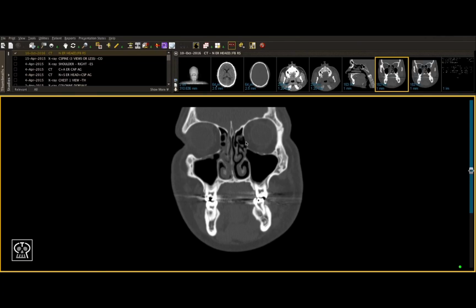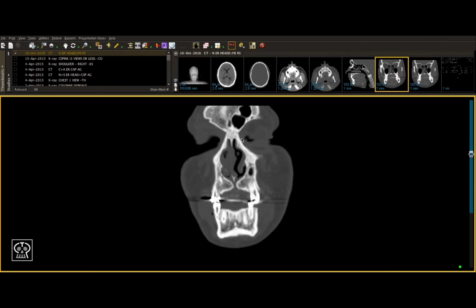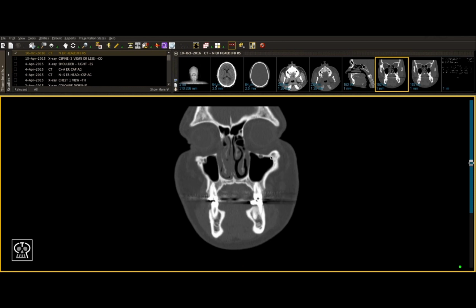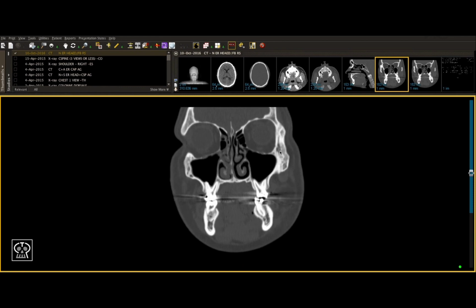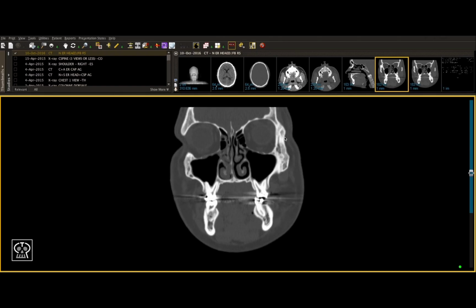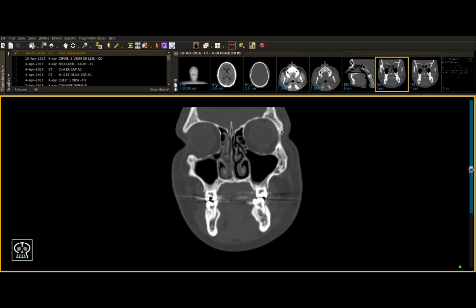later in this video. Once again, starting anteriorly, you always want to examine one side at a time, looking for any obvious fractures of the orbital rims. It's important once again not to be confused by normal sutures. Although we will be covering ZMC fractures in a future module, for example, the connection of the zygoma to the frontal bone can be seen right here.